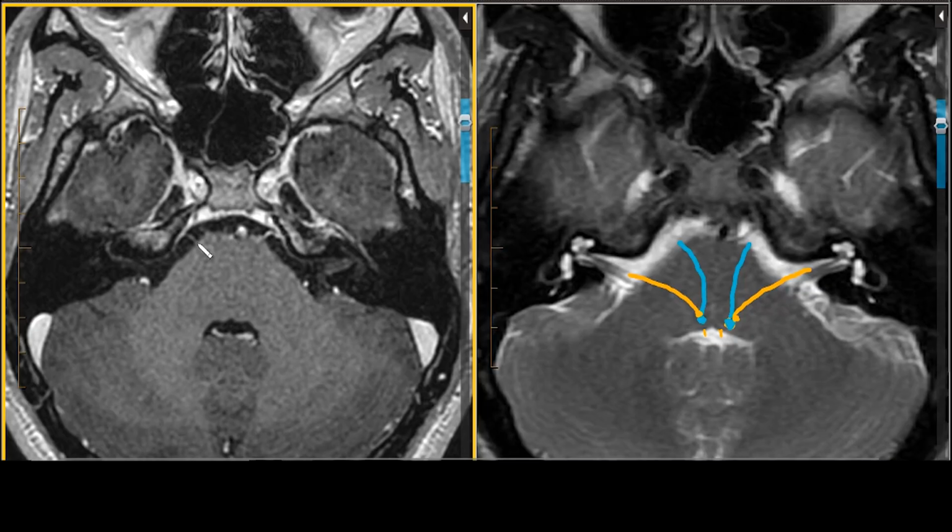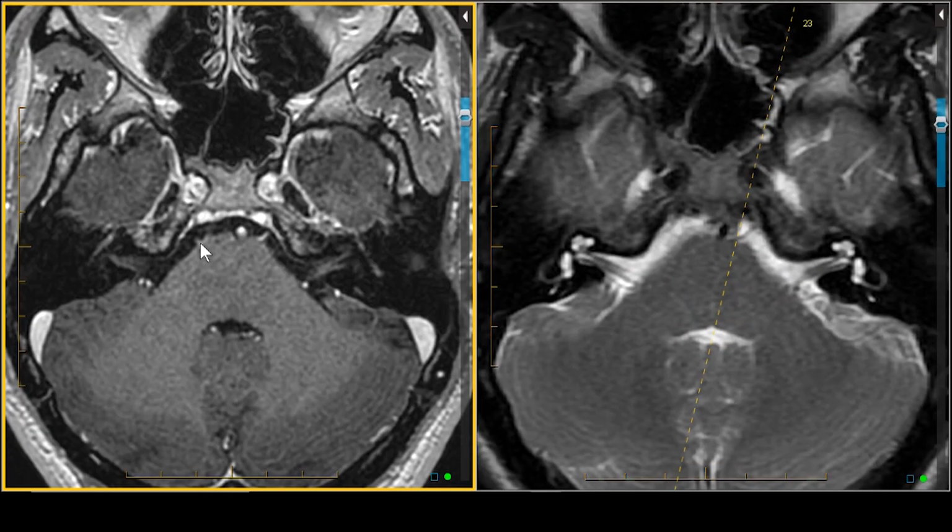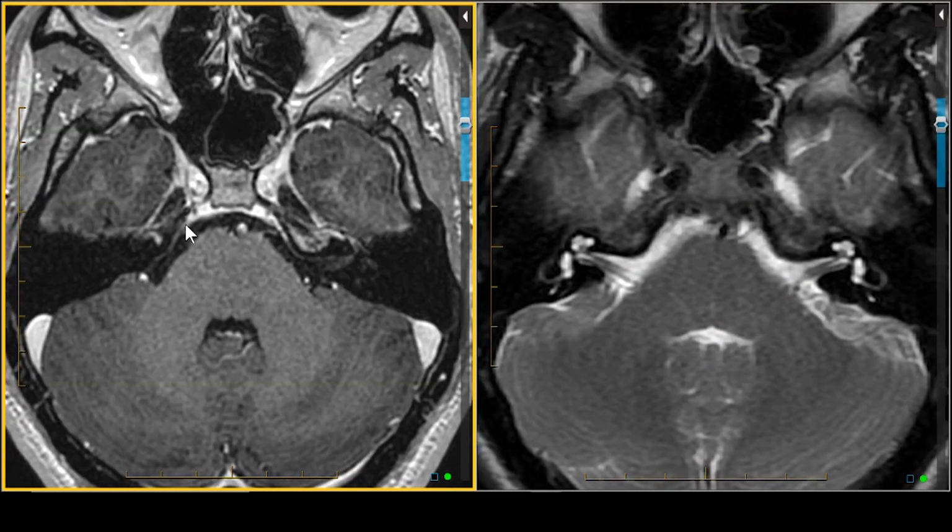Lateral to the pyramid, there is a bland gray structure with an oblique course, not going to the 7th and 8th nerve canal, but let's see where it goes. Let's take away our color, and let's follow it back to its apparent exit. Now let's keep going. It falls right into this little groove right here.